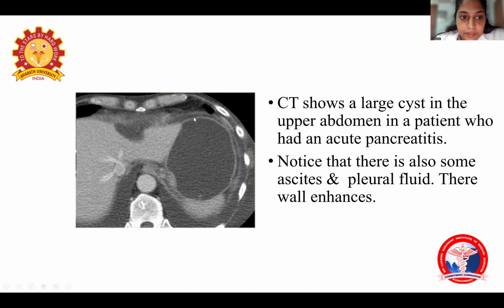You can also see that usually the fluid does not enhance. So here you can see that the wall beautifully enhances. So a pseudocyst has an enhancing wall. There are no septa, there is no calcification. It is a clear, simple case of a pancreatic pseudocyst.